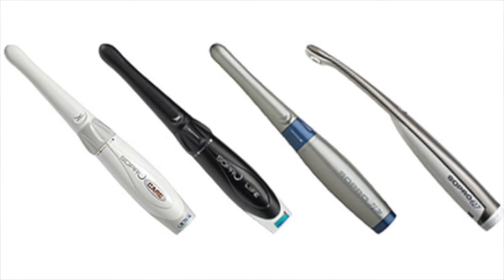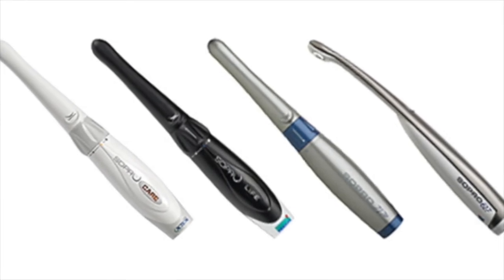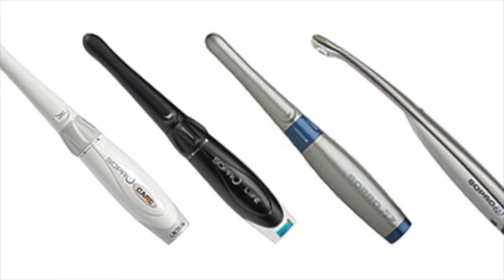Hi, I'm Kevin with Action, and today I'm going to show you how to install Sopro intraoral cameras on Eaglesoft.